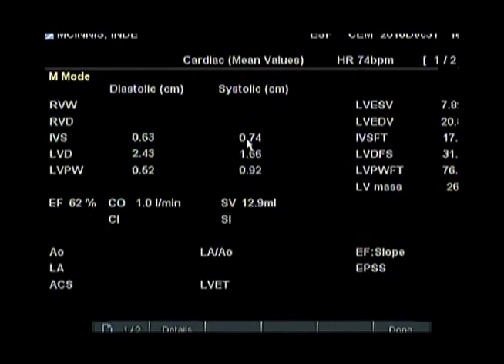If most measurements are normal but one is not, you should consider operator error, which is common. It is very easy to include papillary muscle in your M mode measurement. You can help to prevent this by comparing the measurement you are about to make to similar points of systole on either side of the heartbeat you are measuring, or consider repeating your M mode left ventricular measurements.